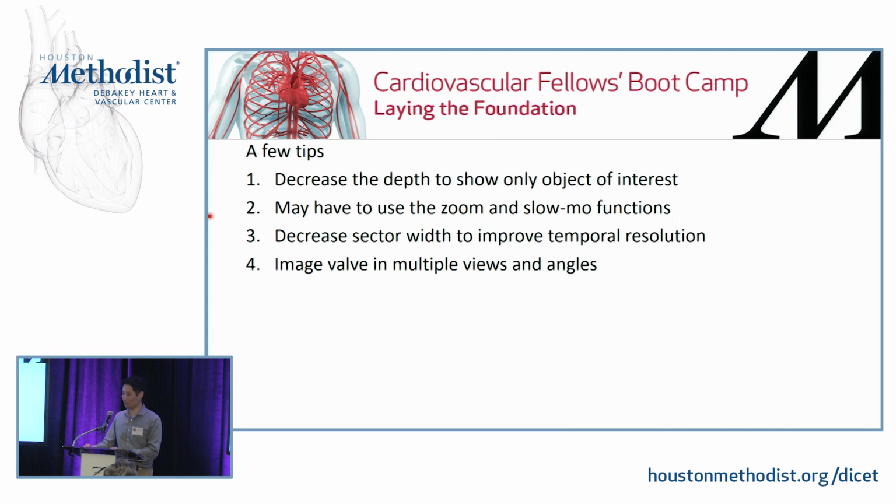Second thing you have to do, especially when you're worried about endocarditis or thrombi, sometimes it's hard to see them because they're moving around really quickly. So if you zoom in and take your time and use your slow-mo functions, you may increase your chance of seeing them better.